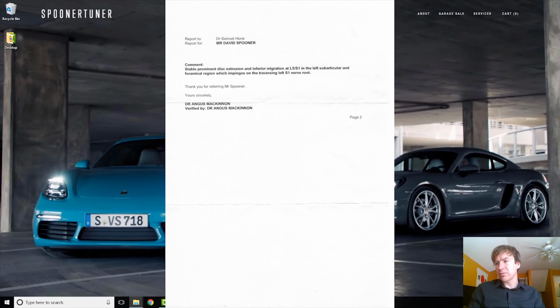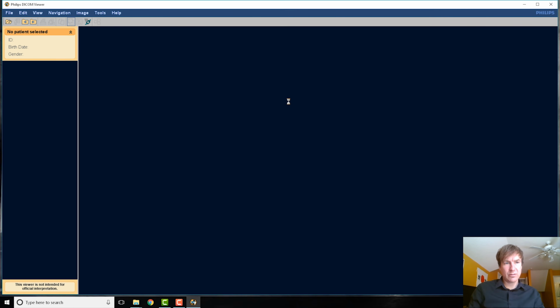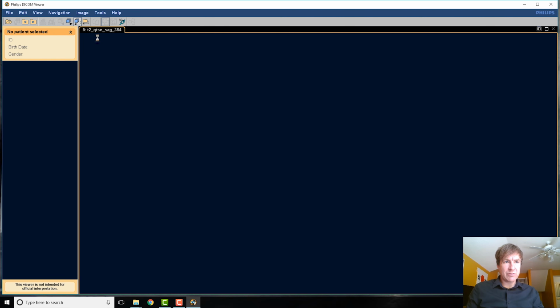So this is the one that you guys have been waiting for, 2018. Alright, so this is the one that I had done in the last video. And this was the one that you guys have been waiting for.